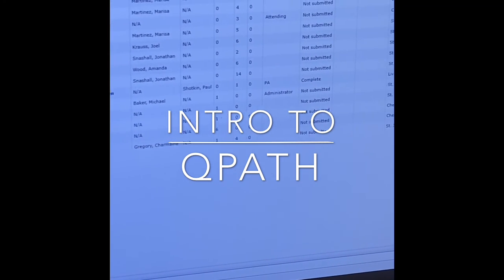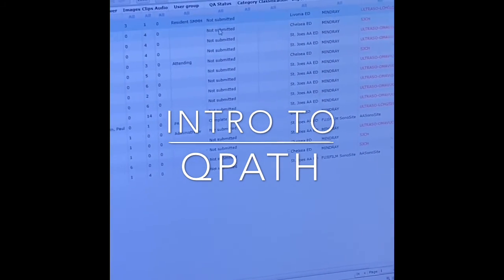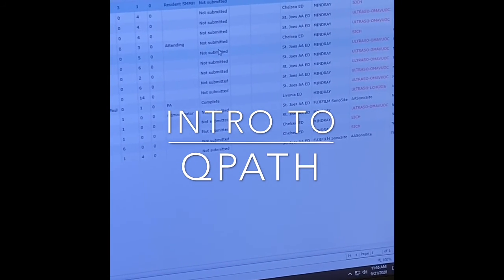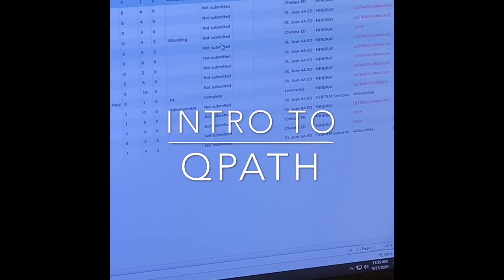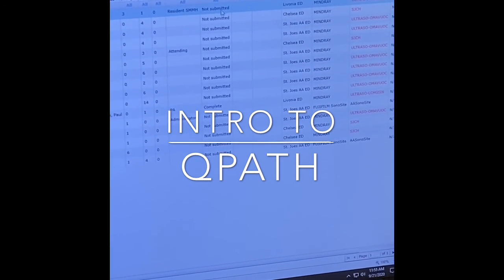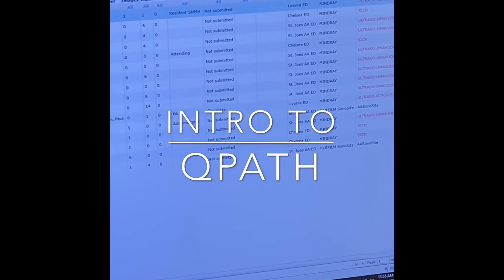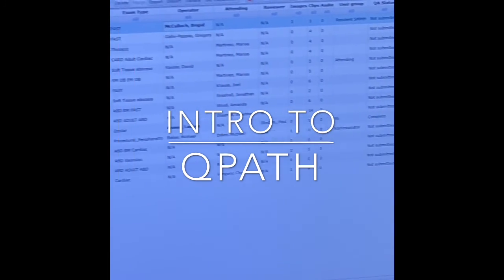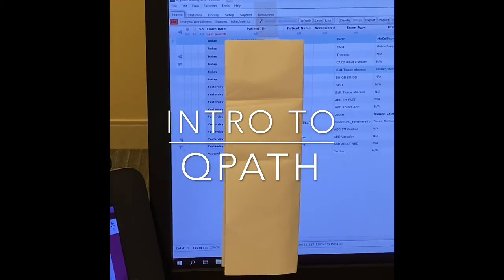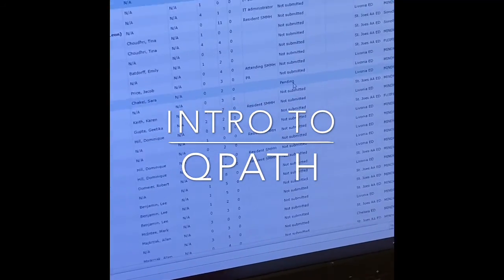The next column is QA status. Here it will say whether or not the study has been submitted for QA and whether it has been completed. For studies that have not been submitted, they are labeled not submitted. For studies that, and I'm going to change this to last month to have more selections here, have been submitted but not yet QA'd, they will say pending.